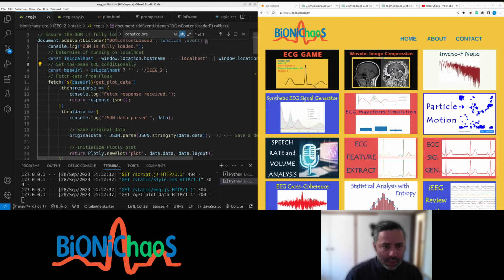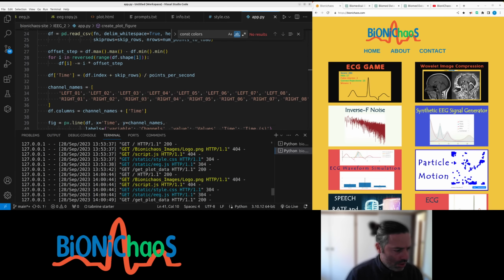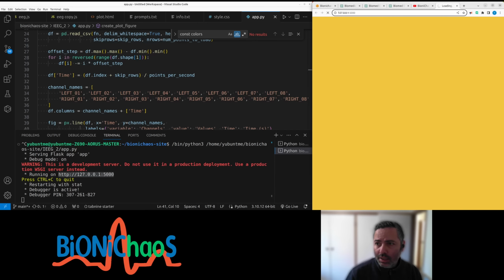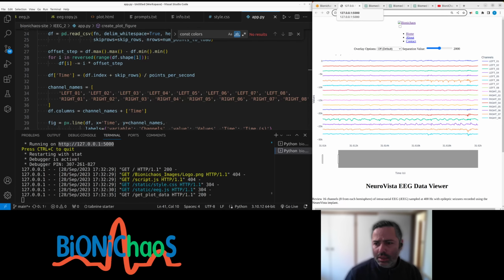Let's start quickly. I'm gonna finish this web application. Let's make this a bit smaller. Let's stop this for a sec. We'll restart it manually, so we can get this link. Right. So that's what it looks like.